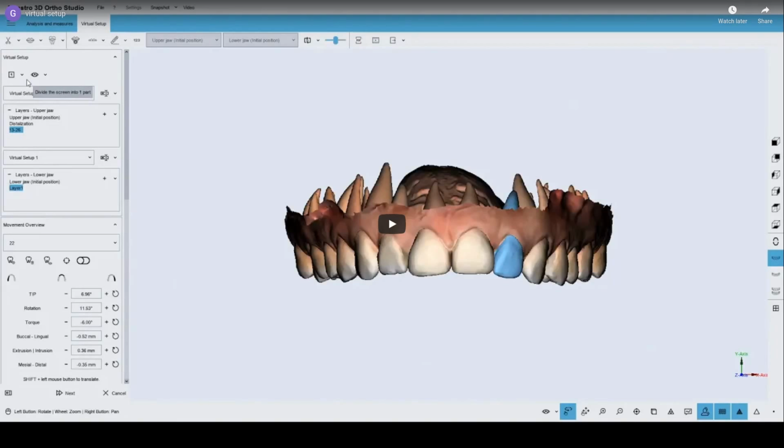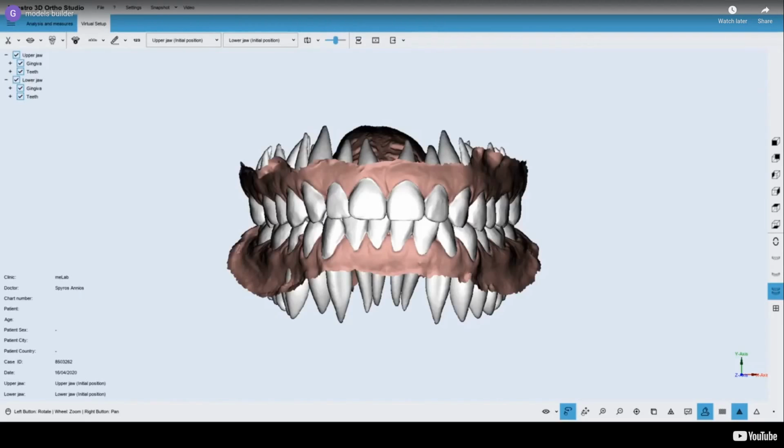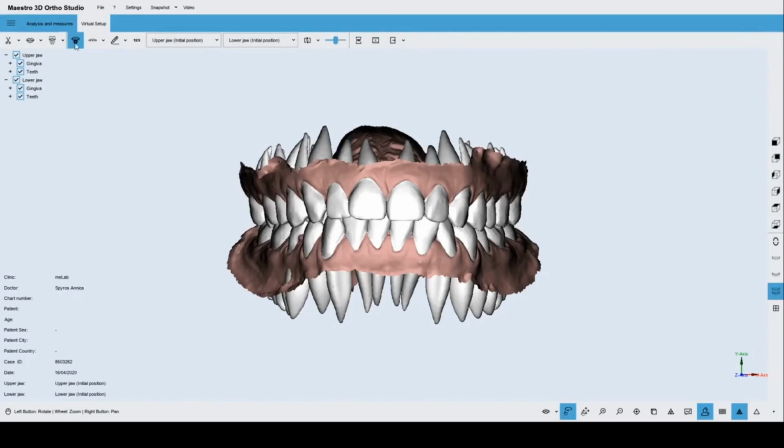We start now another step of the presentation. So we will see now the models builder step.